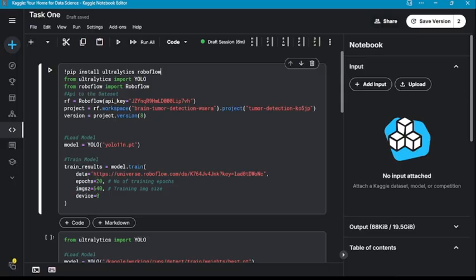The dataset is gotten from Roboflow, and the link is also in the code. Inference is performed on the test images for detailed analysis. What I did first was install Ultralytics, and I got the YOLO11 model and the other libraries I'll be using.